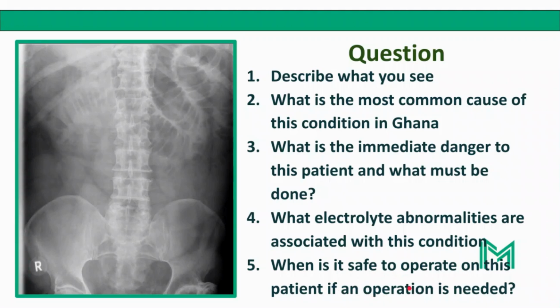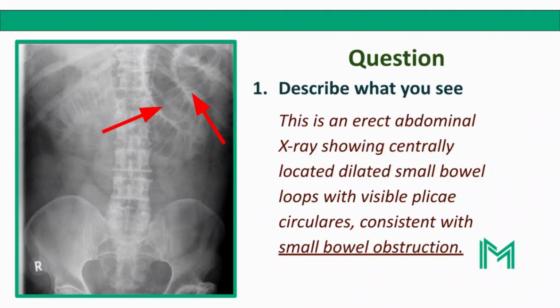Now, what you must note about this question is that if you do not know what is going on in this image, if you do not know the condition that this image portrays, you will not be able to answer the rest of the questions. So, this is a great question for us to go through and understand, so that if we meet it in our exams, we will be able to answer.